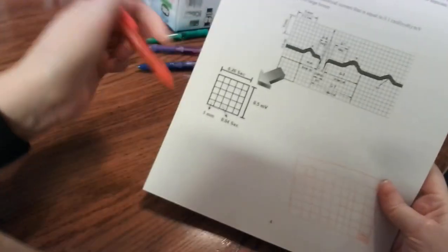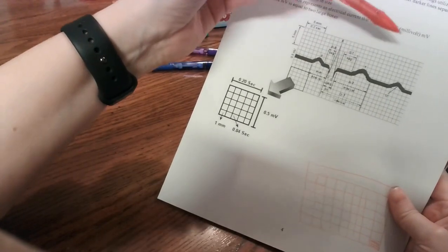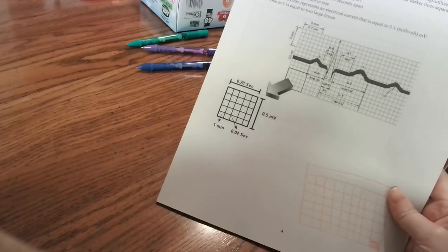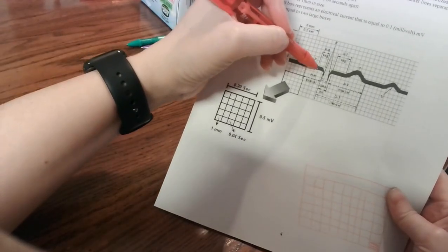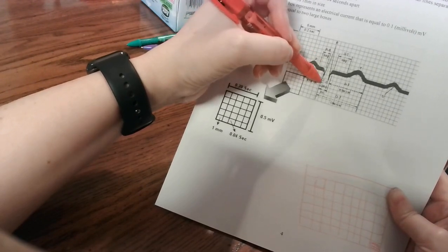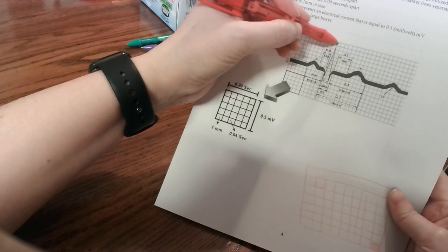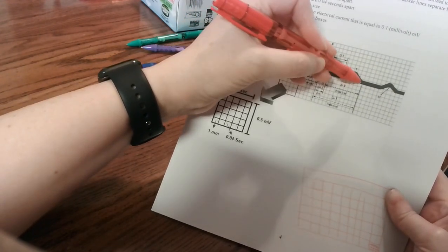The other basics are that you always have a PQRST. Occasionally you'll have a U wave, but that's not standard. The P always comes first, a little bump, and then a QRS. The Q is the first down stroke. R is when it goes up. S is when it goes back down, and then it levels off, and you have a T bump every time.